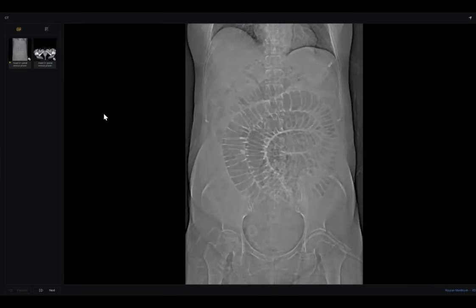What's your diagnosis? This is the scanogram. I can appreciate lucencies over the liver parenchyma, which are linear in structure. However, there is no evidence of pneumoperitoneum. There is paucity of air in the rectum. This opacity or this density in the right hemipelvis could be a gallstone which is causing the small bowel obstruction. I will confirm it on the CT scan.